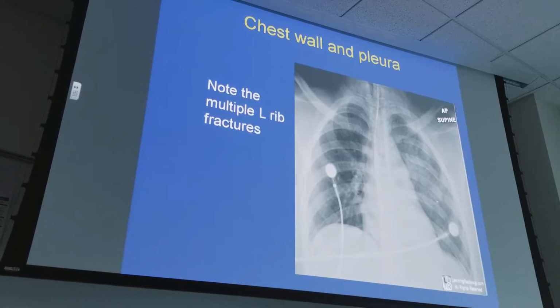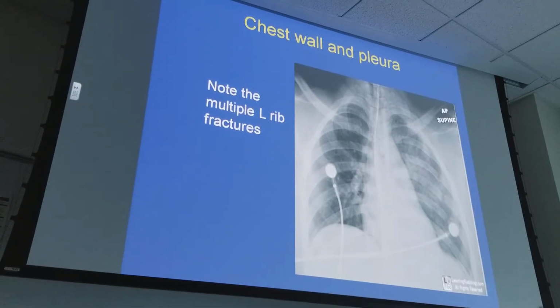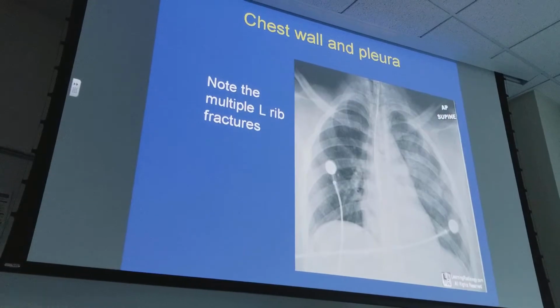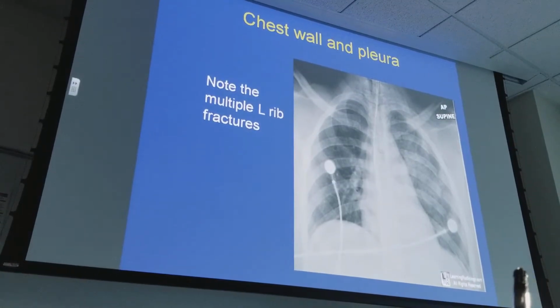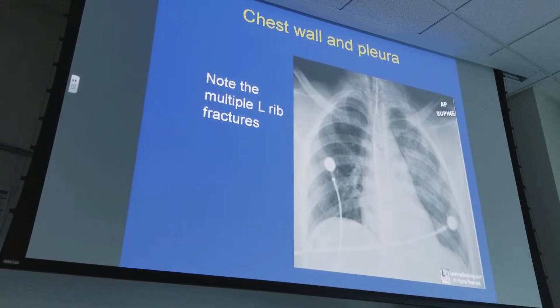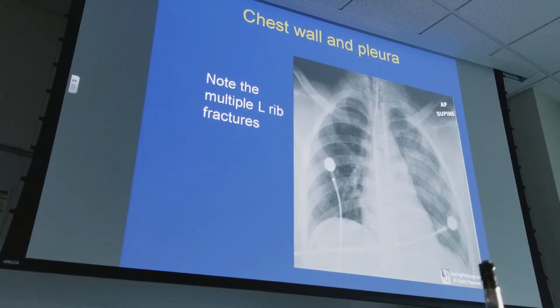Do you have a flail on this chest? Yes. How many say yes? Raise your hand if you think there's a flail. 1, 2, 3. You guys think there's no flail? No flail, Eileen? That's right. What's the definition of a flail? 2 or more, with 2 adjacent.